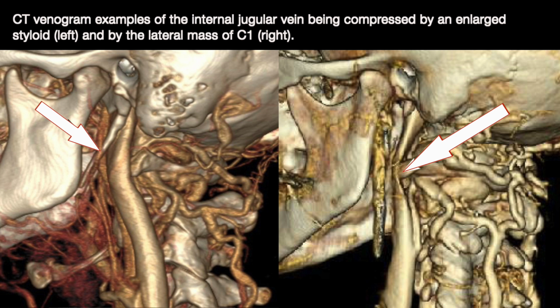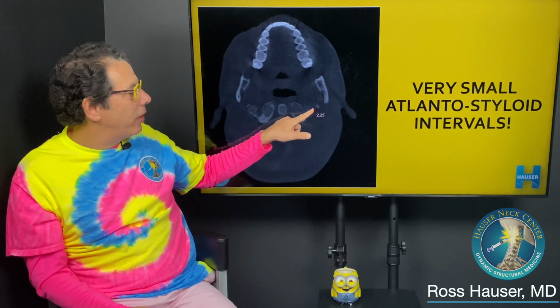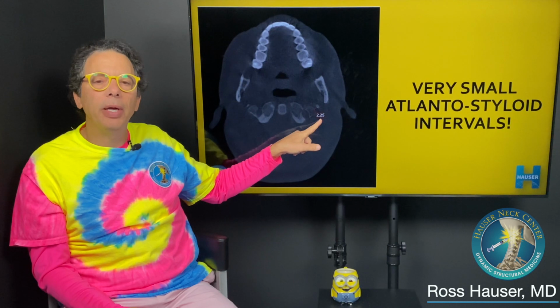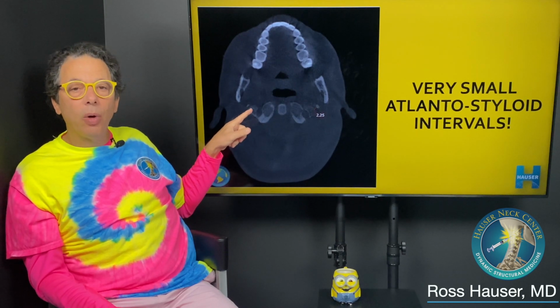You can see that the jugular vein can be compressed by the styloid in the front or the atlas in the back. In this particular patient's cone beam CT scan, you can see the atlas here, and that's the styloid, and there's only 2.25 millimeters on the person's left, and on their right, I couldn't even measure it, so it's less than 1 millimeter.